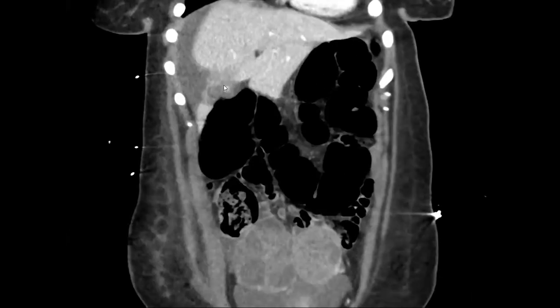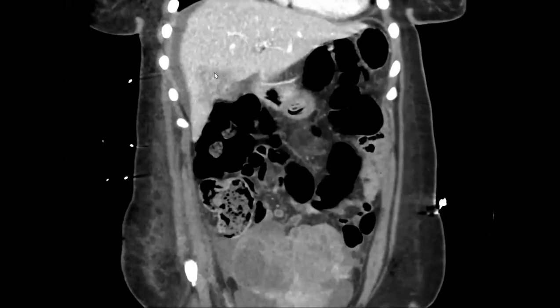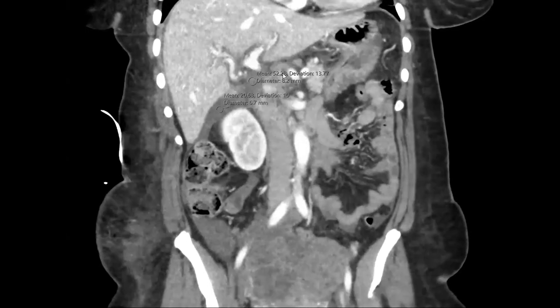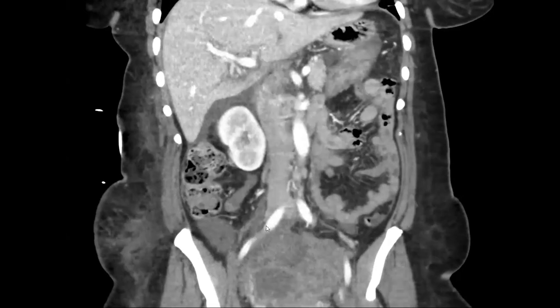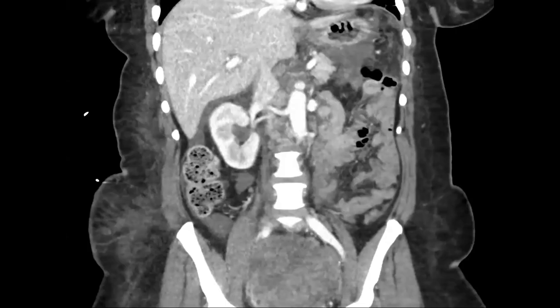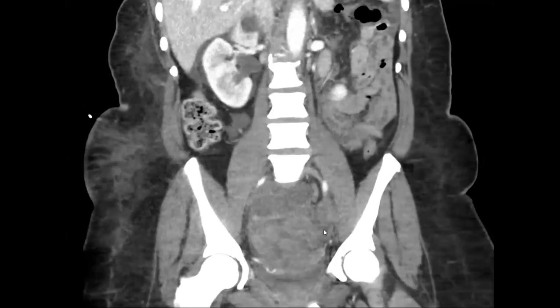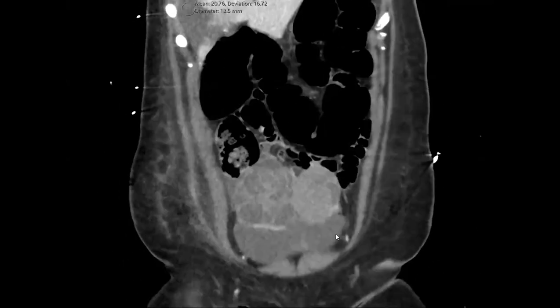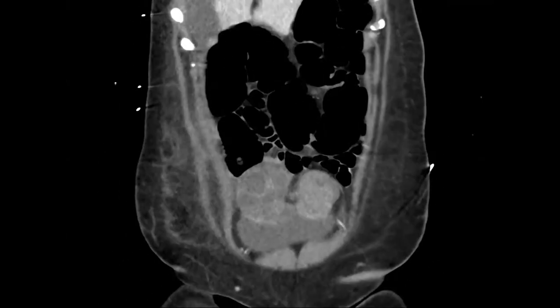But sorry, just to show you the gallbladder stuff here, right? That gallbladder is indistinguishable from this infiltrative tumor here. And then all those lymph nodes. And then, yeah, I think that if you're not sure about the pelvic stuff, always get an MRI. You can see things much better. And that was the case.